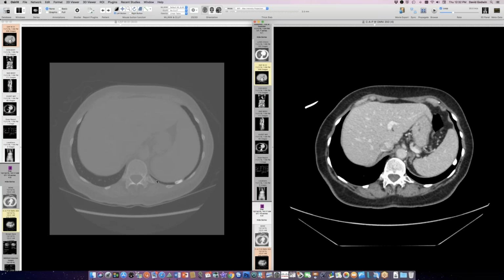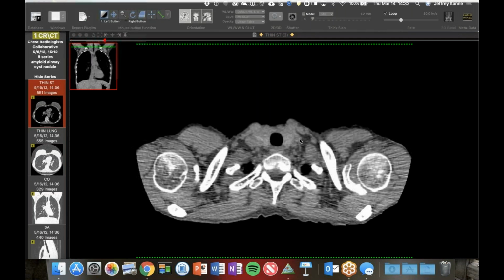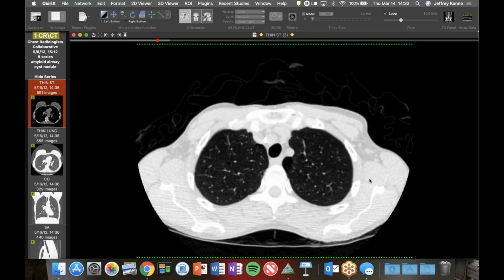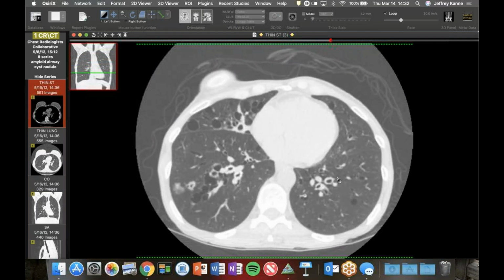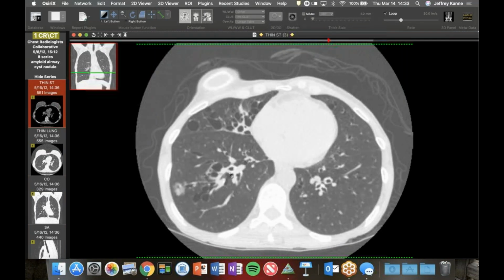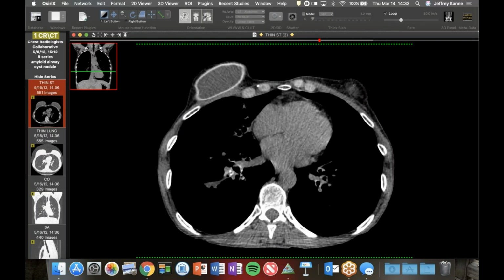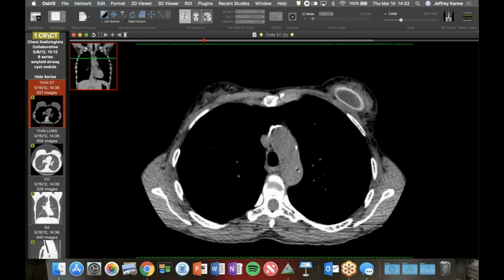Okay, so I'm going to give some follow-up. This was a case that I showed a few weeks ago that Chris Meyer showed me, and at the time we didn't have a diagnosis, but he posited that this patient had a certain diagnosis. So the findings, I'll go over them again, were these basal cysts, many of them perivascular, several nodules in the soft tissues, and then this striking bronchial wall thickening. On soft tissue window, you can see it's not only thickened, and it is circumferential, so it's involving the membranous portion, but it also has this faint calcification, but did not involve the trachea and main bronchi.